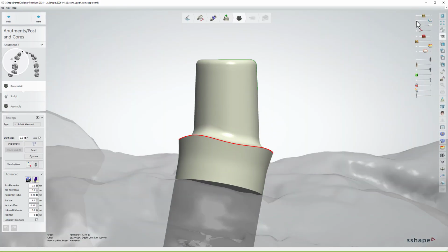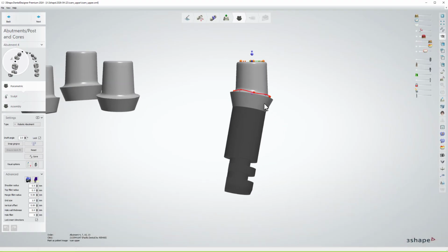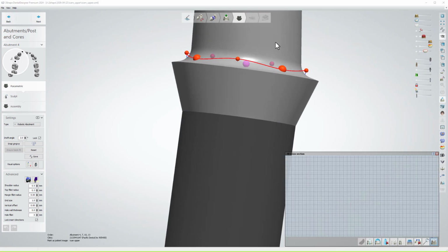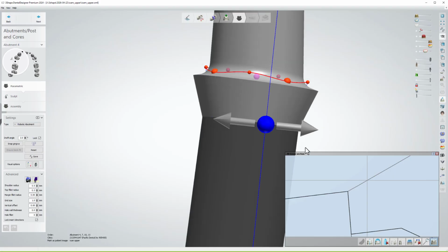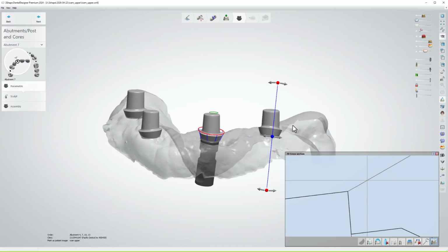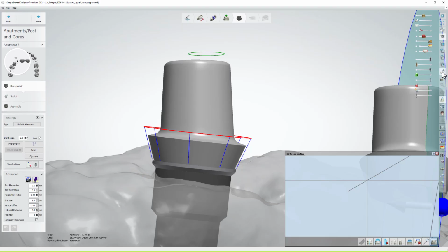Does it align? Does it not align? Let's see. Moment of truth. DES, I think that's good. 2D crosscut. Yep, right there on the corner. Now, let's come to here. This is True. Is this true? Yes, this is true.